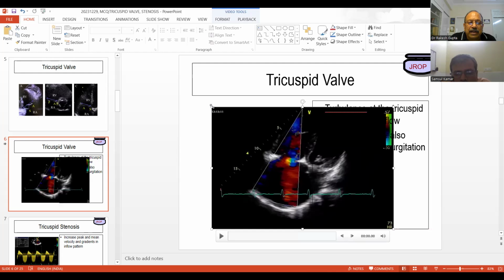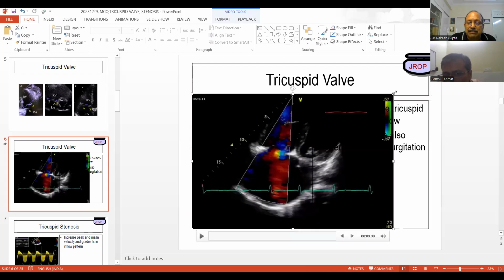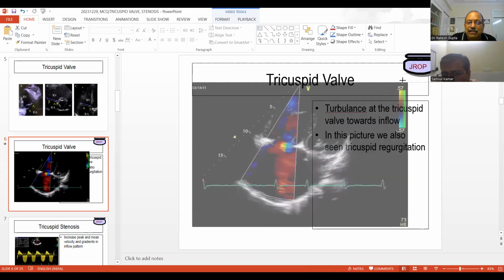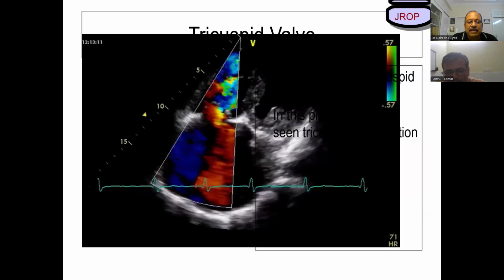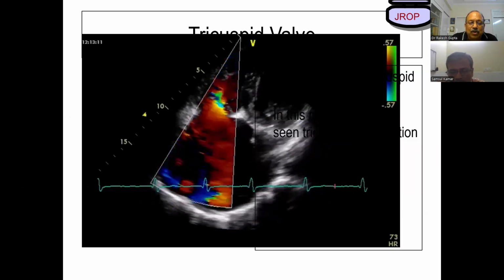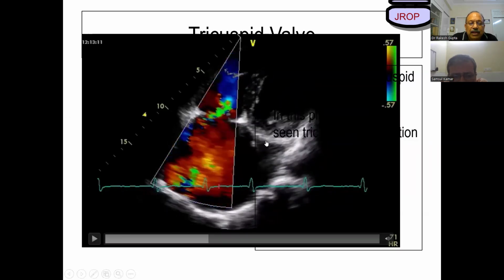And you will never forget to understand which is the significant lesion. This is valid virtually in every subject, and is not commonly seen very easily. I'll focus and tell you what the lesion is. So I'm focusing. Look, what do you see over here? Anyone can open their mic and tell me.